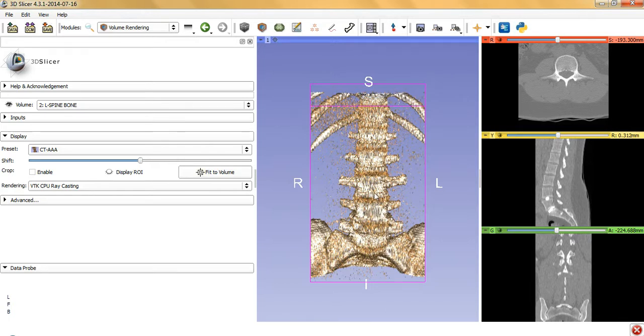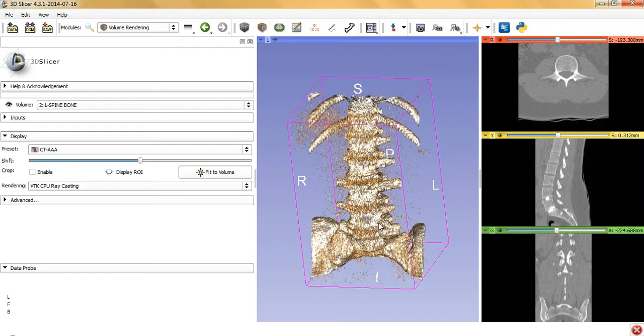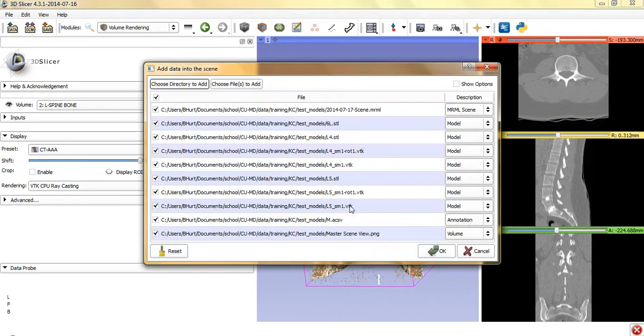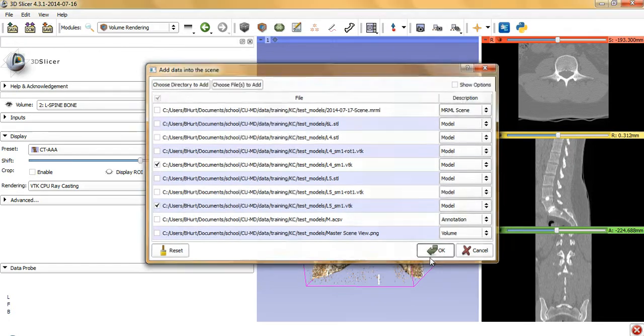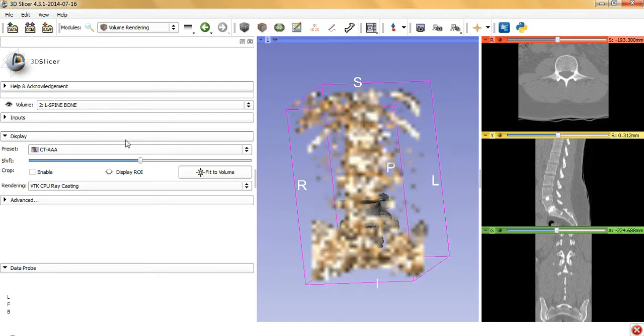However, now extracting, say, L4 and L5 here is another story. It's not exactly trivial, and so much of the bone segmentation that is done is manual, and for the sake of this tutorial, I have manually extracted L4 and L5, and I'm not going to show it here. I'm just going to load it in. Just give me a second. Just pull up the two files. And there you go. It should be loaded in. They should come here. L4, L5. It's the gray. Looks good.